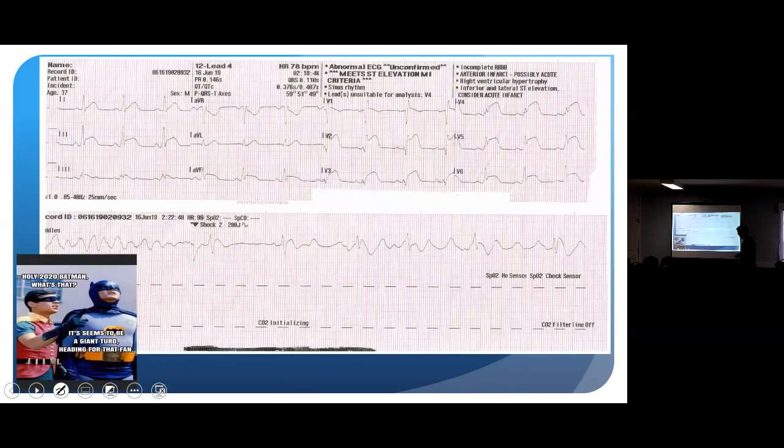And this was, I think, in the summer. Young guy, chest pain, EKG, the rate is okay-ish. You start looking at injury patterns, one in aVL, I go over here and now I get sweaty, right? I'm popping an aspirin because he's making me uncomfortable. Dude's having the big one. EMS popped an aspirin, okay? Normally on medical calls, you stay, you evaluate, try to stabilize. STEMIs, you can't fix in the field.